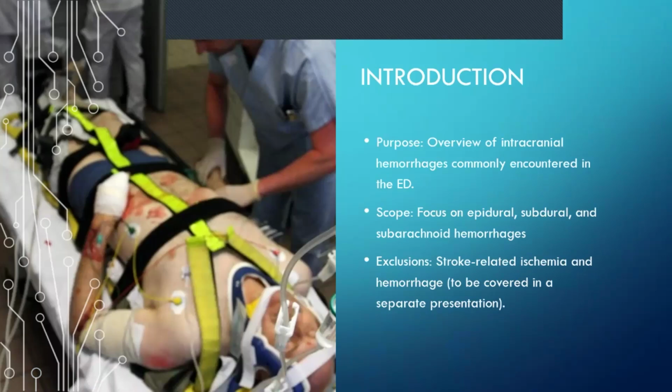So today we're going to be looking at epidural, subdural, and subarachnoid hemorrhages. And this is often something I found amongst the junior doctors. An epidural gets called a subdural, gets called a subarachnoid. It's fine. It's easy to mix these things up, but it's good if you know the difference and you know why each one is the way that it is.